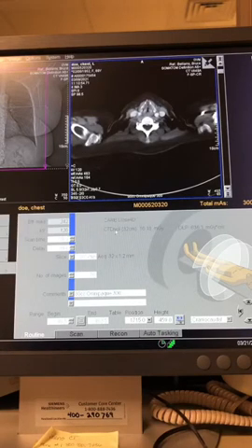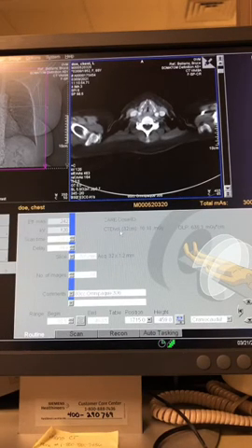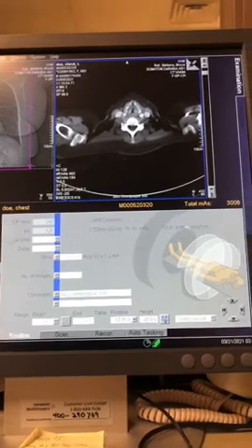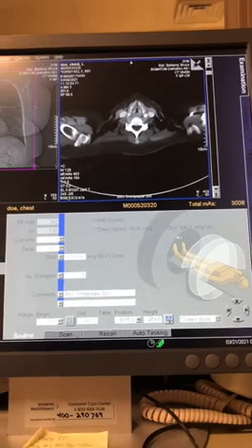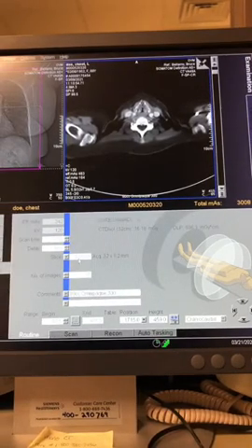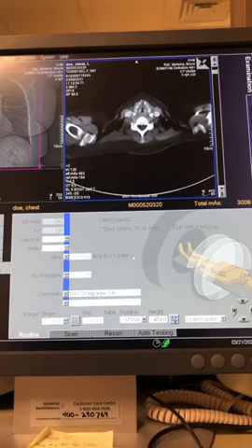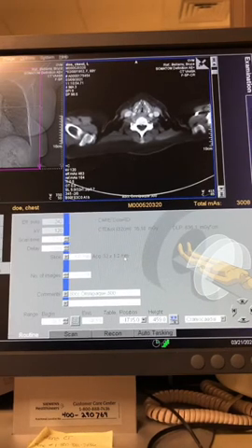And it's also telling you what the CTDI is going to be based on all this information, and the dose length product based on all this information. So that's pretty awesome. It's all right there. Note the reconstructed slice thickness is 5 millimeters. Okay, so acquired at 1.2, reconstructed at 5. What this means is that I can go back as long as the raw data is available, and I can reconstruct all the way down to 1.2 millimeters. This scanner does have an option to allow me to go to 0.6 millimeters. Okay, so just keep that in mind.